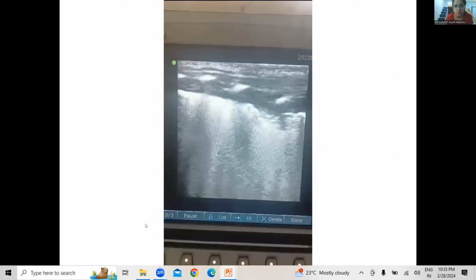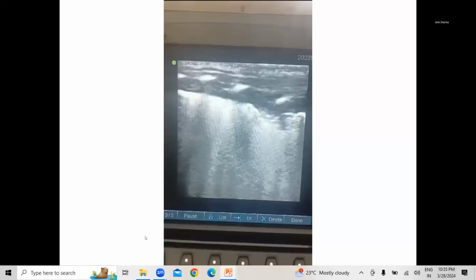This is another area. Almost similar picture in all the areas. Focal consolidation, a really nice hallmark there. So that's a focal consolidation. Might be a fractal sign.